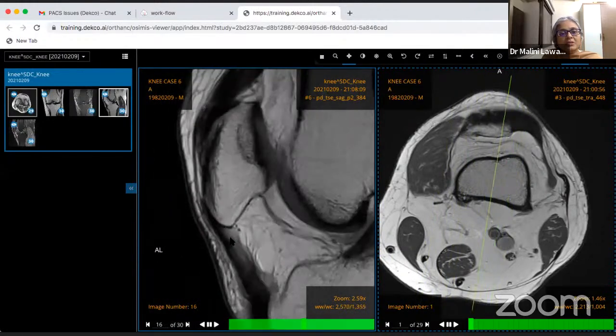Can you see this slender black line? That will be the avulsed fragment. There'll be soft tissue edema, some marrow edema may be there, but this black line is what would give you the avulsion in pediatric periosteal sleeve avulsion. So it's important to know where the pain is, for us also to try to identify it better.